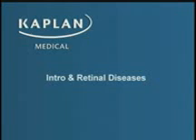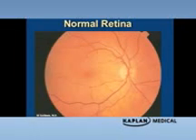The most important part of our investigations is to look at what the normal retina looks like. The normal retina should have predominantly a beautiful, clean, clear space in between the blood vessels. You will see here as we examine the image, the normal blood vessels coming out make up only a small part of the retinal surface. The majority of the retinal surface is free of blood vessels so that the light can penetrate.